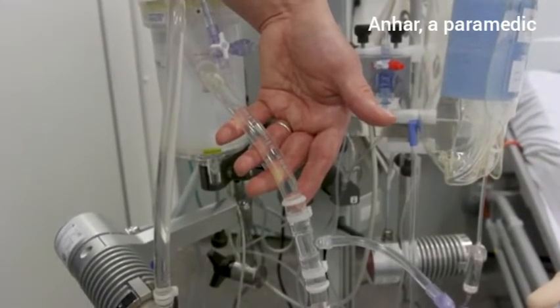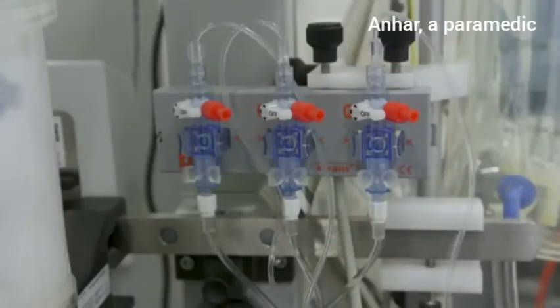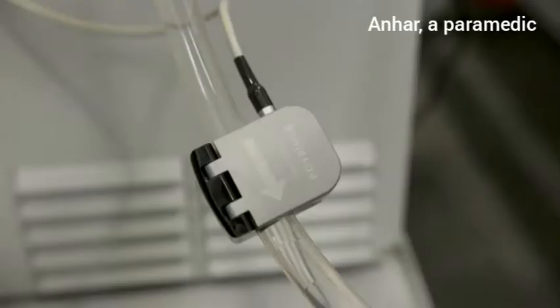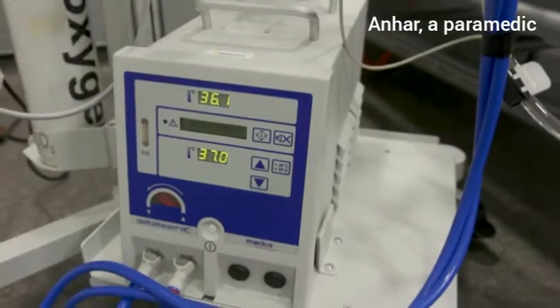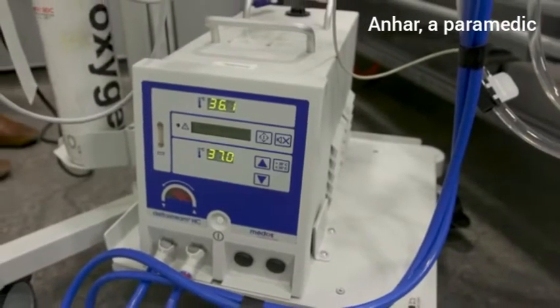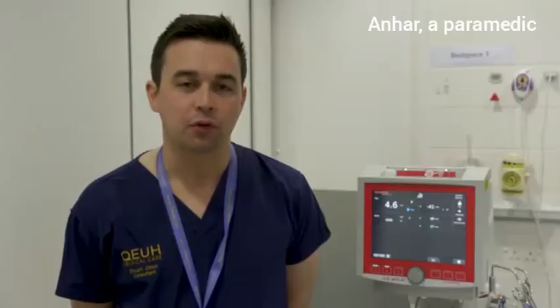Other ancillary components of note are the pressure and flow monitors. These provide feedback on the performance of the circuit, and the heater-cooler unit, which maintains extracorporeal blood at a physiological temperature. When ECMO is used in the management of severe respiratory failure, it is usually in the veno-venous or VV configuration. That is, blood is drawn from the patient's venous circulation and is returned to the patient's venous circulation.